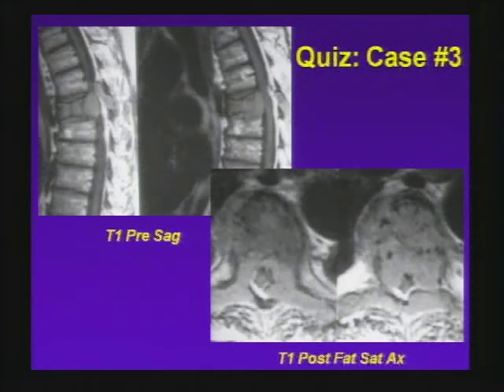And this one, I'll just give you a little moment to look at the features here. Once again, every pixel of marrow has converted to abnormal, so this is unlikely to be osteoporosis. What about the posterior elements? And remember how I said you've got to look at the posterior elements on the sagittal because you might not always have the right axial, and make the most of your film. So there is a lamina that's expanded, and here you see beautifully on the axial tremendous expansion of these lamina. This is sort of the Michelin man vertebra. It's been all blown out.